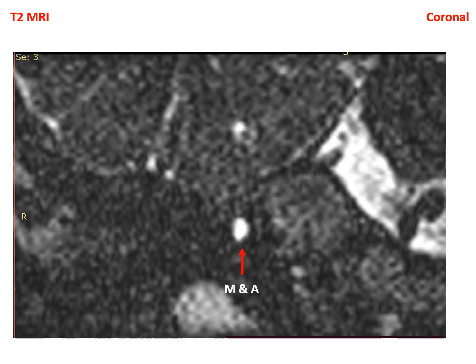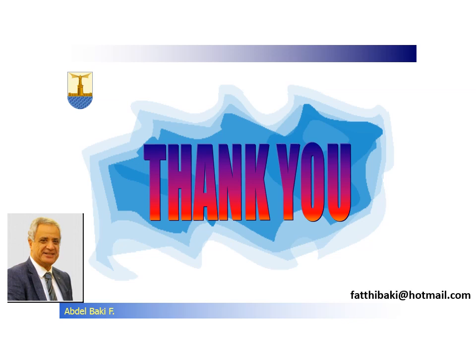I hope that I have covered the T2 sequence of MRI for cochlear implant in normal findings. It usually shows the fluid inside the cochlea as a very high signal intensity, and the nerves will show by the contrast with the fluid around, delineating the nerve.